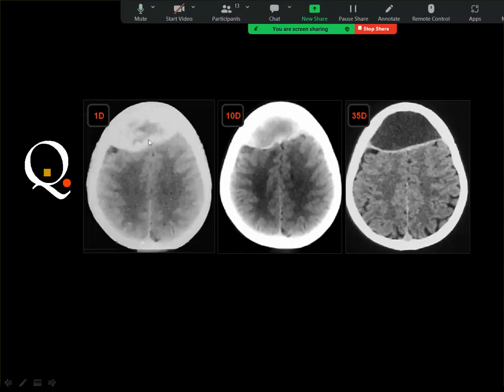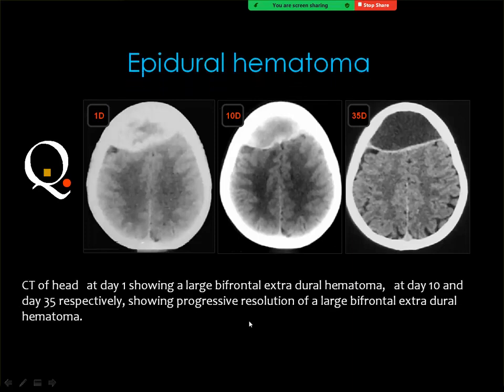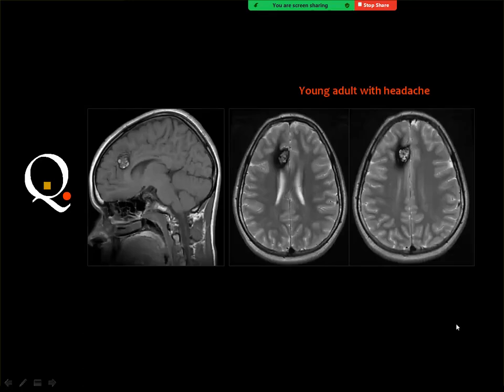The hematoma was bright in the CT scan obtained on the first day, then the density decreased by day 10 and is now a chronic epidural hematoma. This is not usually the case for epidural hematomas to pass from acute to chronic, because an epidural hematoma is present in a tight space and produces significant symptoms. Then it is evacuated before passing into the chronic phase.